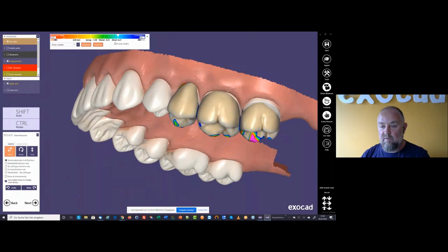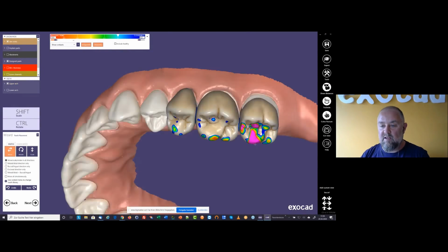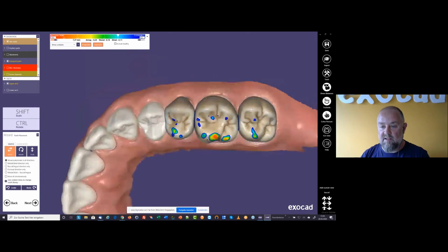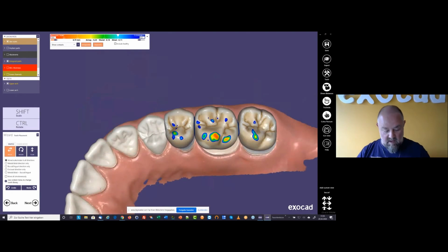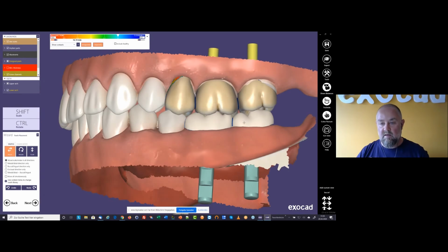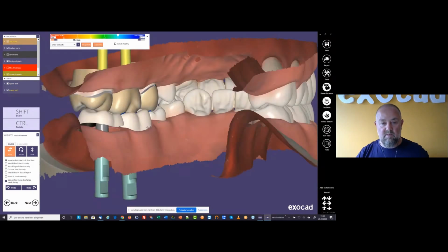So, but then if you do the placement, you try to avoid having such huge pink areas, which means that you have a very deep intersection here in that area. Okay, now again, I will show also my lower jaw, and then I will try to do some corrections on both simultaneously. I think it doesn't look that bad, what I'm doing here.